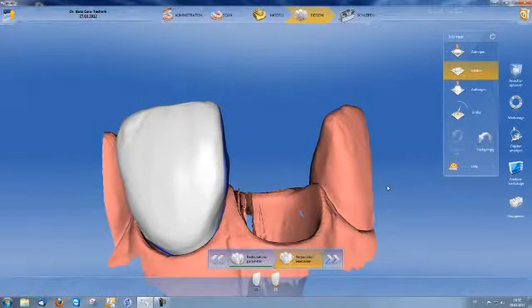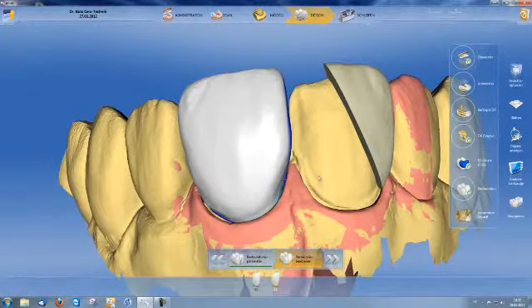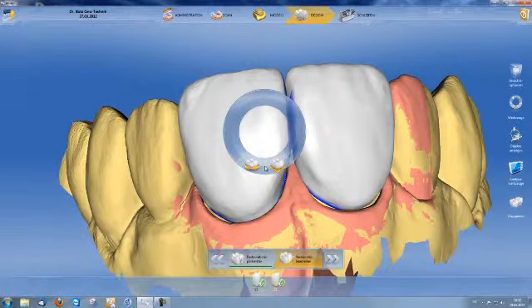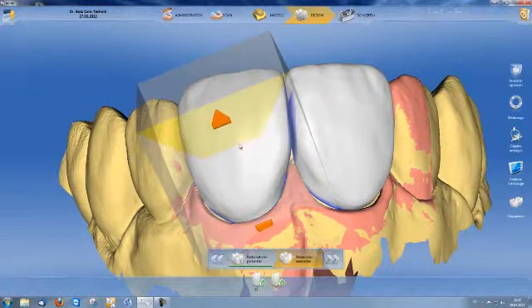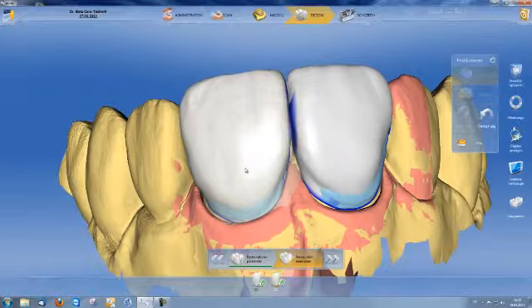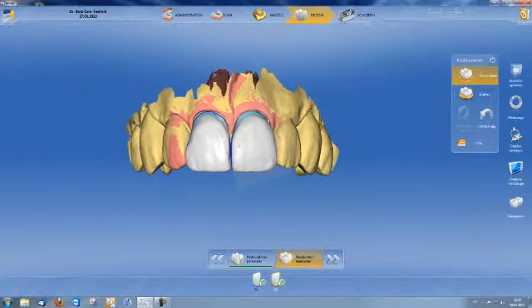I can then move the veneer if so desired. For this, I deactivate trimming, and then regroup my restorations and can then extend or reduce the length of the veneers via the position tool. I view this in its entirety with the lower jaw.